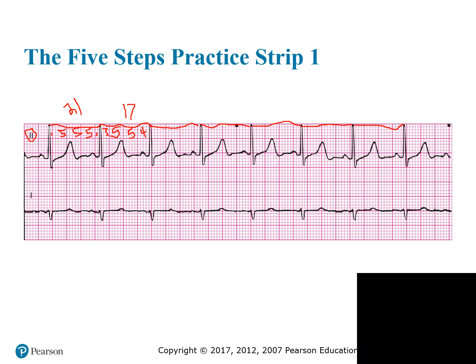Here we have 5, 10, 15, 16, 17. Oh, I can't count. I know what y'all saying. Oh, Miss Tina. Sorry, 17 here too. 17, 5, 10, 15, 16, 17.